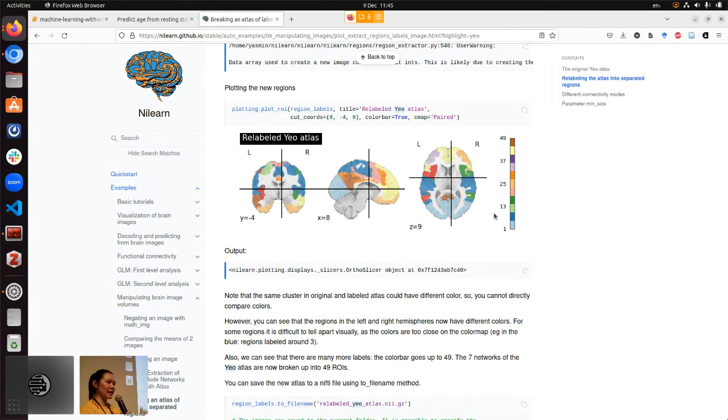The reason they are put into the same ROI as a network means, based on the algorithm the atlas creation was using, all these voxels have similar properties and are equally important in that manner. So that's why they are put into a network.